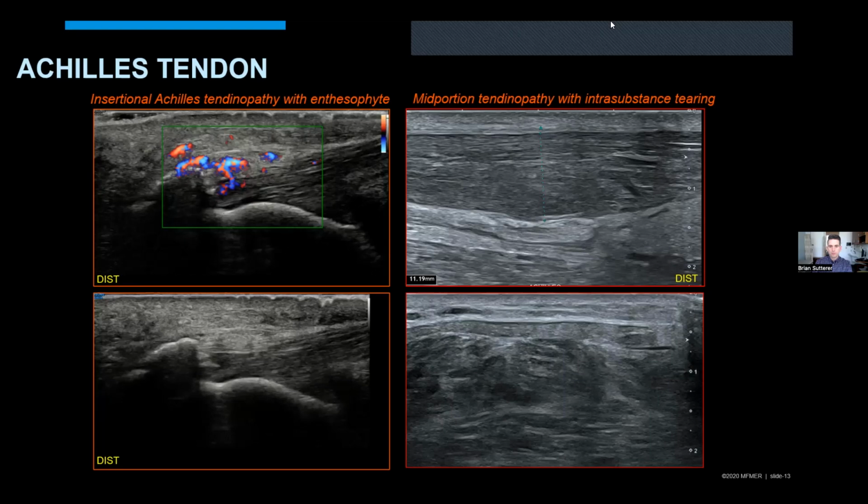For those that do a lot of procedures in this area, we look pretty closely at the pattern that we see. In your case, I get the sense that you think that bony projection at the lateral insertion is potentially a pain generator. That might be very different than when you see a large Haglund with a lot of partial undersurface tearing, and maybe you address that differently than if it's more isolated in the retro-Achilles bursa, for example.